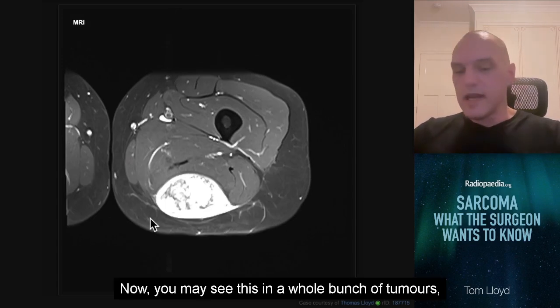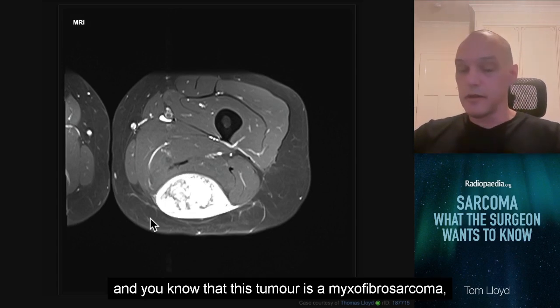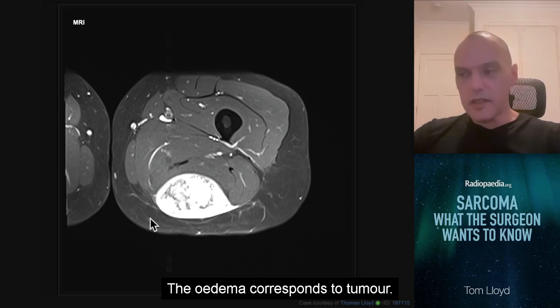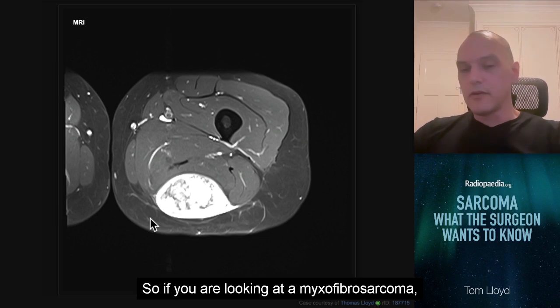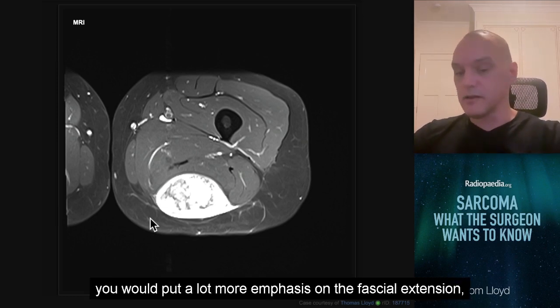Now, you may see this in a whole bunch of tumours, but if you know the histologic subtype and you know that this tumour is a myxofibrosarcoma, that enhancement corresponds to tumour. The edema corresponds to tumour. It doesn't always with other subtypes. So if you are looking at a myxofibrosarcoma, you would put a lot more emphasis on the fascial extension.